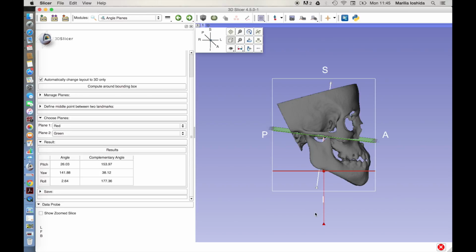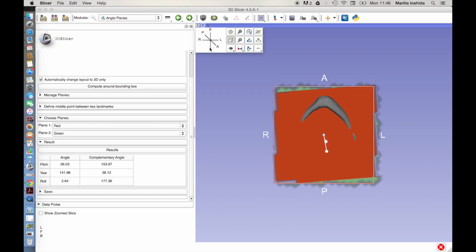You can take the little arrow and move it to make sure that it's parallel to the mandibular line. Drag the points as you see fit to get the resulting plane you desire. Here, we make sure both posterior and anterior portions are in line.